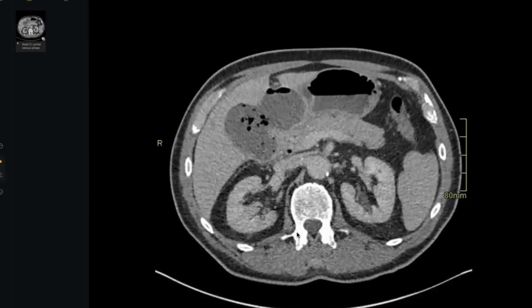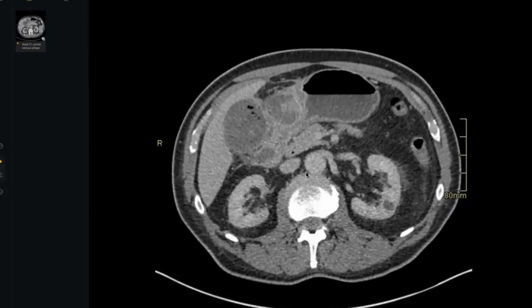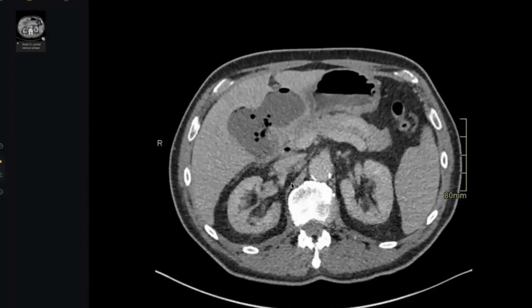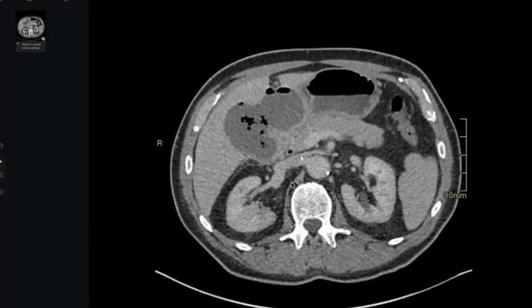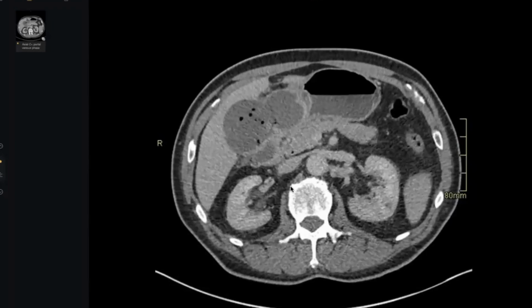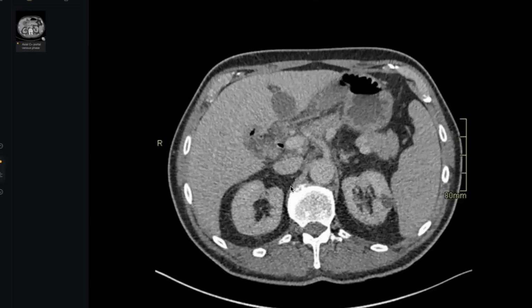So it is likely an infective process, likely emphysematous. Yes. You likely see the emphysematous gallbladder. I cannot see the normal gallbladder and no normal enhancement. So it's likely emphysematous gallbladder with the adjacent collection formations in the adjacent hepatic parenchyma.